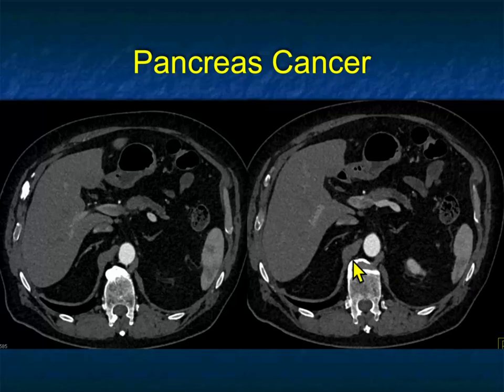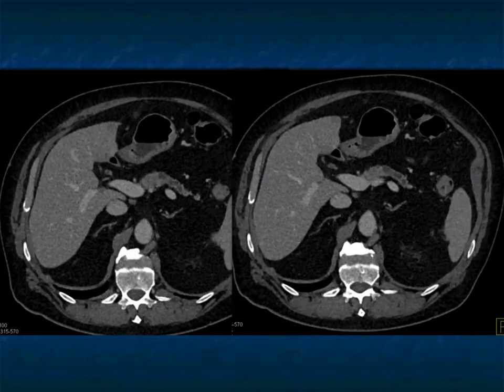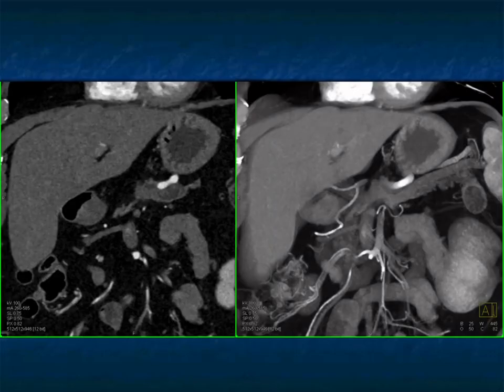Another case, dilated pancreatic duct. There's a transition point. Yes, is there a mass here? You point to it, it sure is. There's textural change. But the key thing to me is the common duct and the pancreatic duct. There's no common duct dilatation because it's a body lesion. But look at the pancreatic duct. The pancreatic duct is dilated. There's atrophy of the distal body and tail of pancreas. There's a cutoff. Yes, you don't see a mass that's large, but you want to pick up a small mass. This patient is resectable at this time because there's a small mass present.